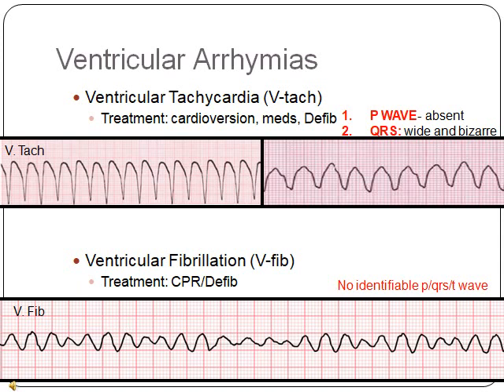This is usually caused by structural heart problems like cardiac scarring, etc. In ventricular tachycardia, the P waves are absent and the QRS waves are wide and bizarre. This is probably the easiest arrhythmia. You probably don't even have to go through the 5 steps. I would just look at it and you just see it's a VTach. If you look at it down below, the QRS is the only thing you could see, and it's just wide and bizarre. There's nothing else that's going to look like that. So that's easy to tell.